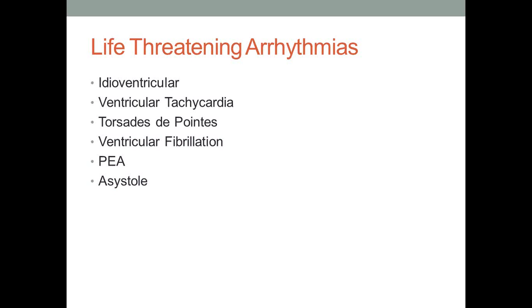So now we'll get into our life-threatening arrhythmias, and these ones are fairly easy to identify. We're going to talk about our idioventricular rhythm, our VTAC, which we talked about a little bit already, our torsade de pointes, which is a form of VTAC, our ventricular fibrillation, our PEA, and asystole. PEA stands for pulseless electrical activity.